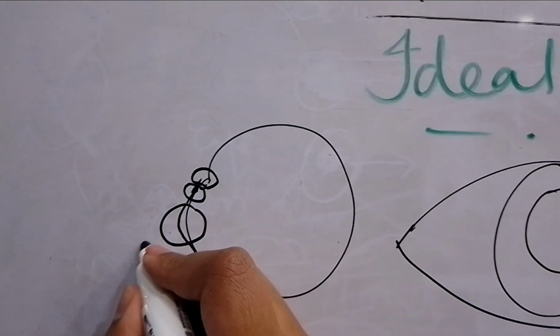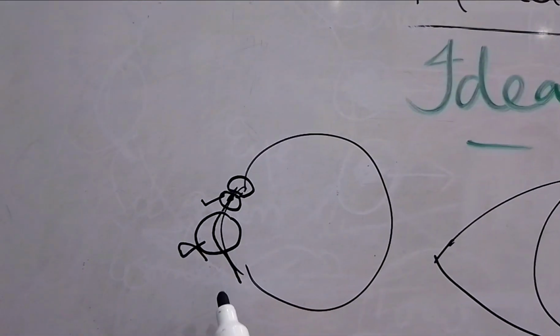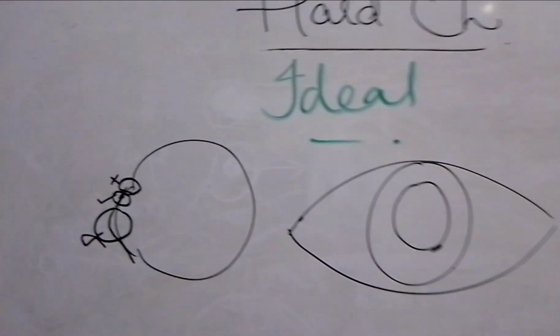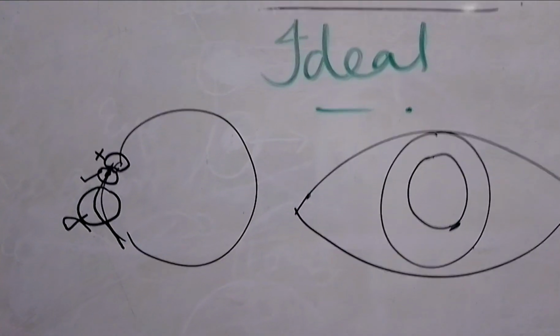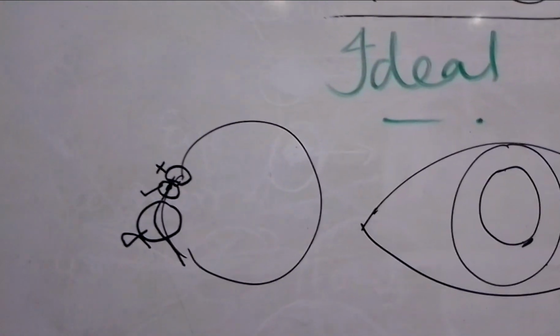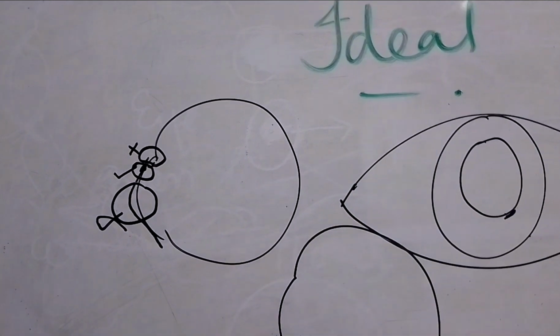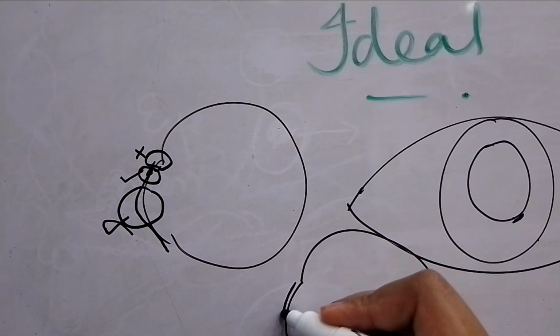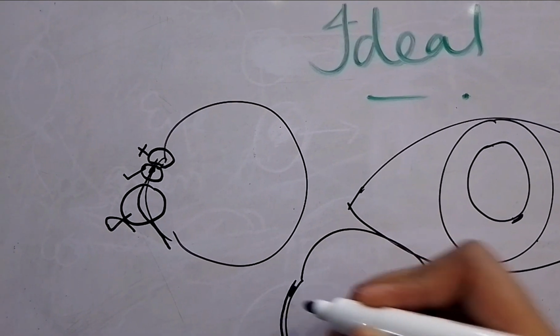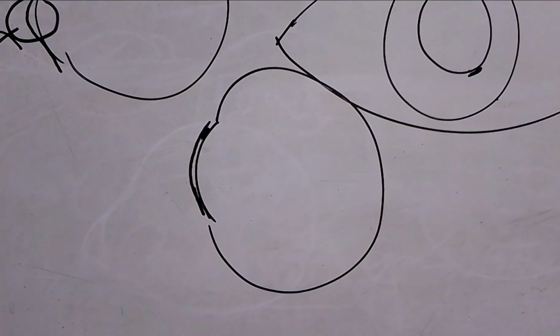So apex should not be in touch. The mid periphery should be in touch, and again the edges should not be in touch. So this is the ideal fit. Now this steepness is shown in this diagram very much, but basically how it will appear, it will appear as if the contact lens is properly aligned. It means that the contact lens is properly aligned to the cornea in an ideal fit, right?